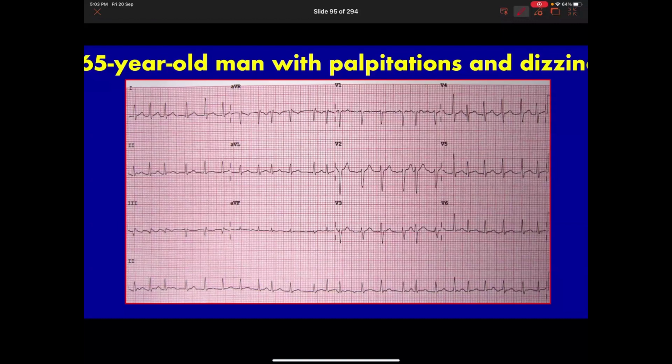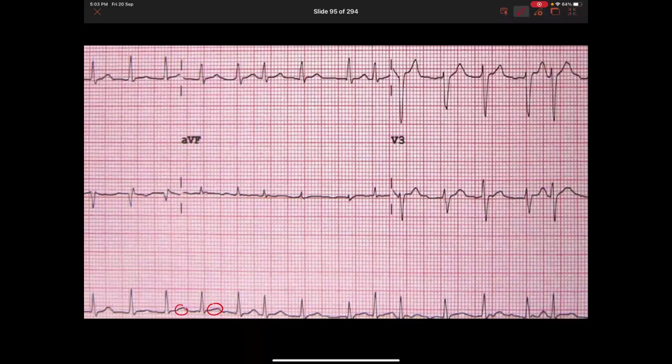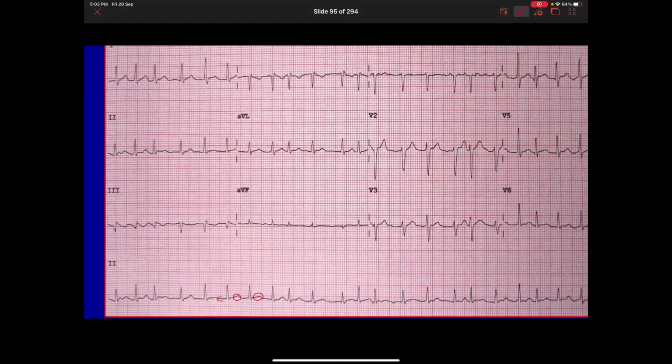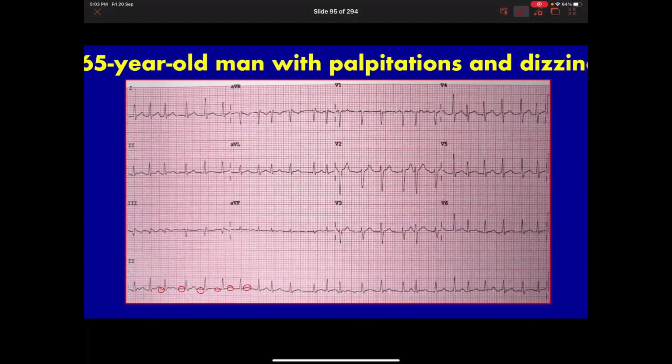There are like bumps. This is not a P wave. Be careful. We look at the one that's before the QRS. So here, there are no P waves. There are more like bumps. So when you see no P waves and irregularly irregular, see it's very irregular, immediately think of AFib, atrial fibrillation.